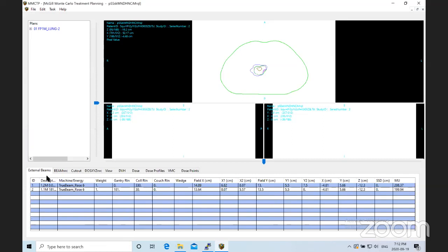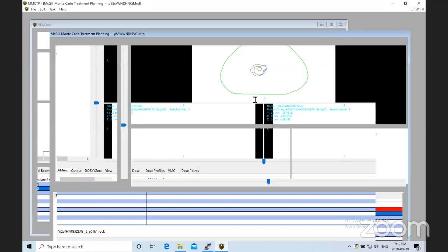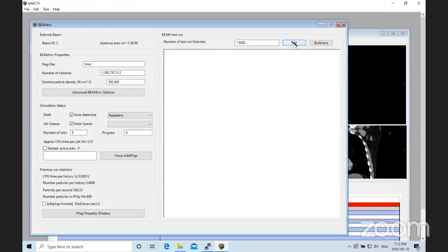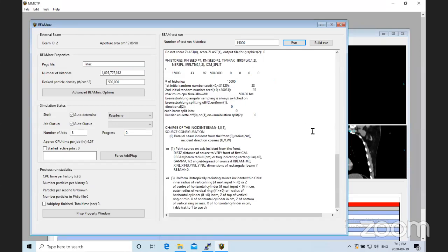Okay, so let's try this again. So I will go now and let's do this other beam. Okay, everything is fine.